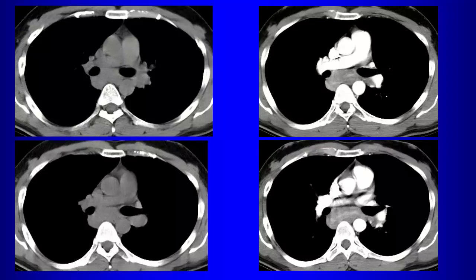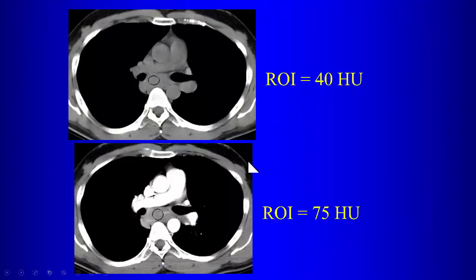So what kind of esophageal tumor would look like this? An enhancing mass. Most of it looks like it's outside the esophagus, right? So what kind of tumor would that be? That would be a GIST tumor, gastrointestinal stromal tumor, right? So that probably should also be your differential here. But this was lymphadenopathy from tuberculosis.